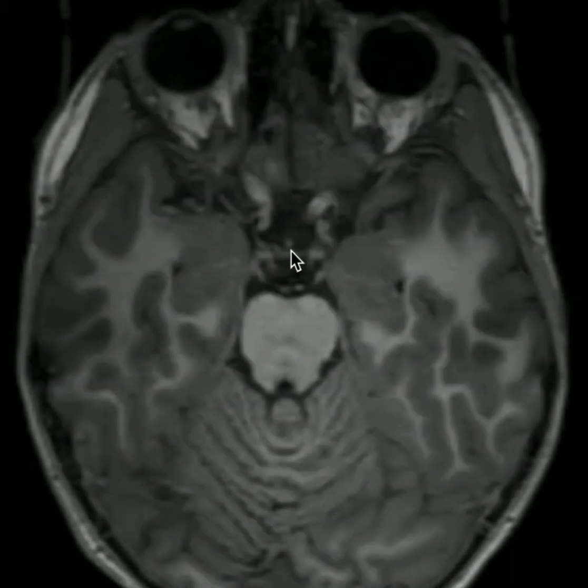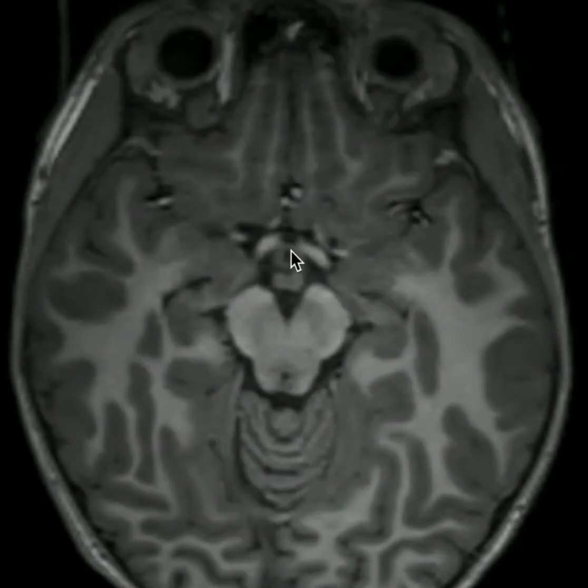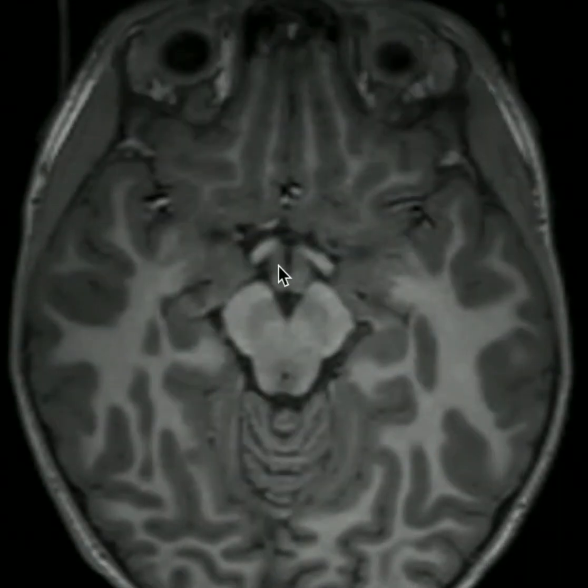Scrolling back superiorly to the level of our floor of the third ventricle, recall that the tuber cinereum, seen right here just behind these optic tracts and anterior to our mammillary bodies, is a part of the hypothalamus. Most people will consider the mammillary bodies, here and here, a part of the hypothalamus as well, in addition to the group of nuclei along the floor of the third ventricle. Let's now look more laterally out at our amygdala and also at our hippocampal formations.